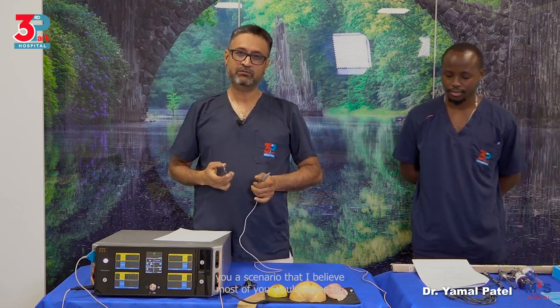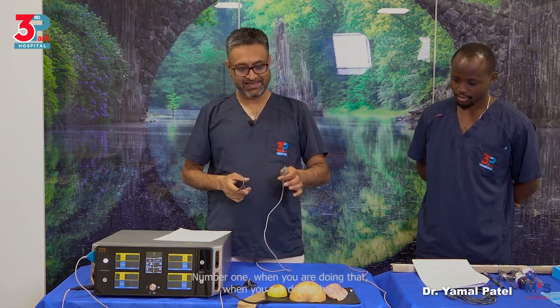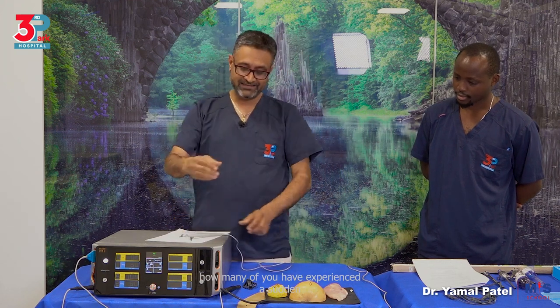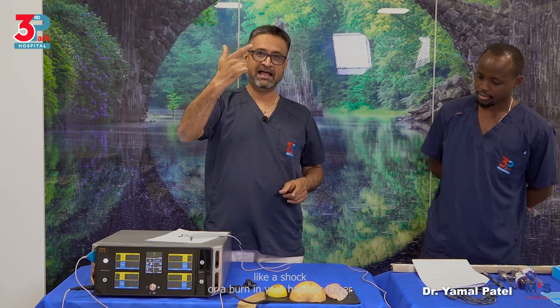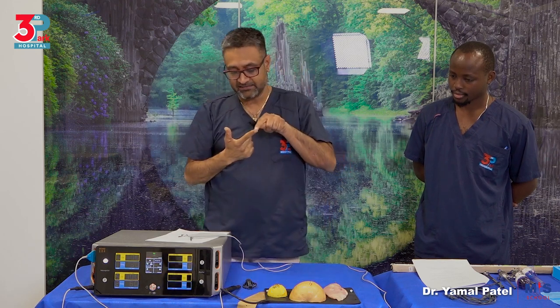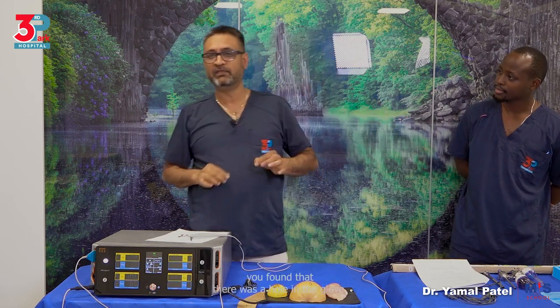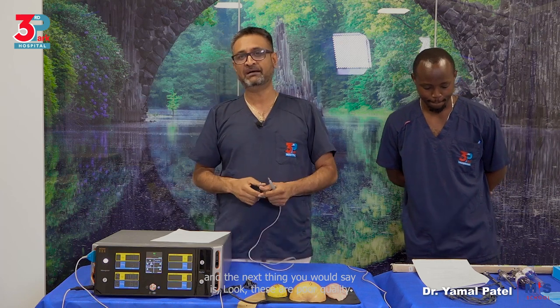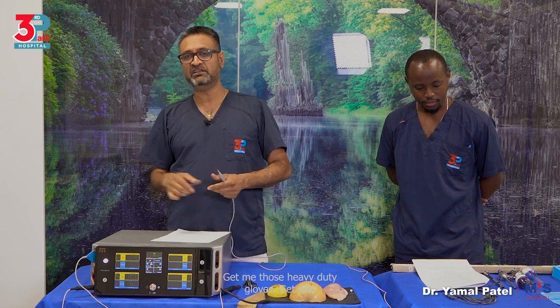So let me give you a scenario that I believe most of you would agree to. Number one, when you are doing that, how many of you have experienced a sudden shock or a burn in your hand or finger, and then you removed your glove only to realize there was a burn on your hand, and when you looked at the glove, you found that there was a hole in the glove. And the next thing you would say is, look, these are poor quality gloves. Next time, don't give me such gloves. Get me those heavy duty gloves.